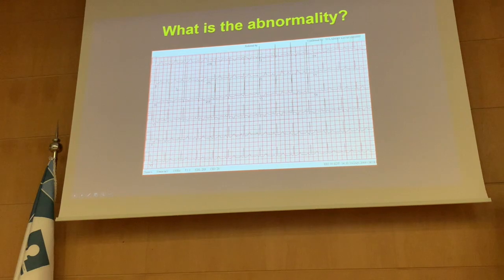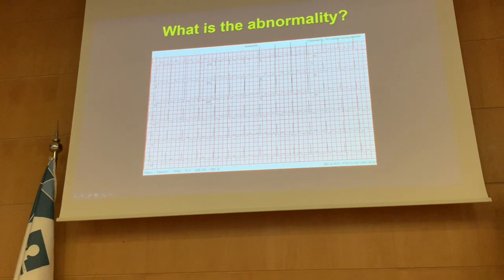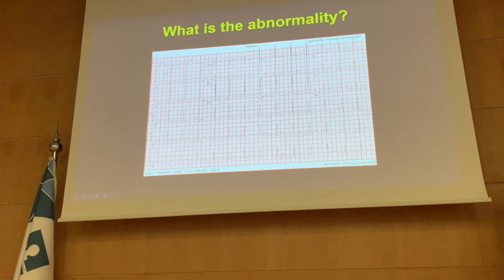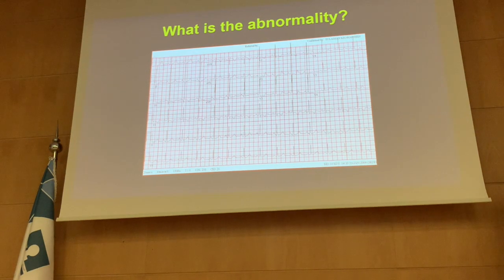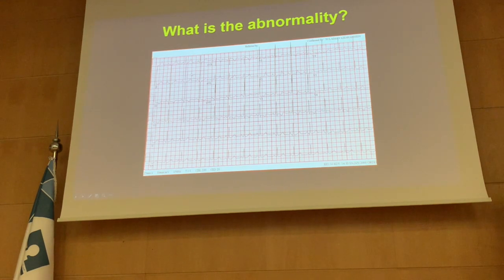Okay. So this patient was referred from Dr. Sulaiman Kharabsha's clinic, he's a consultant cardiologist. The patient is young and healthy, whatever the age, 17 or 16, and he wants to join a football club. By protocol we have to do an ECG for those patients.